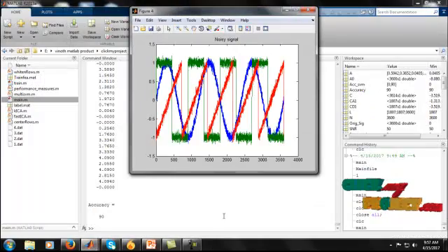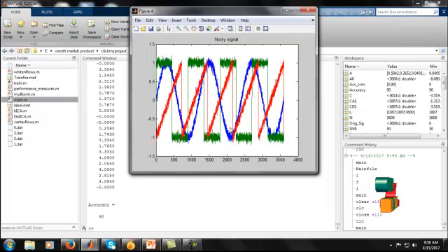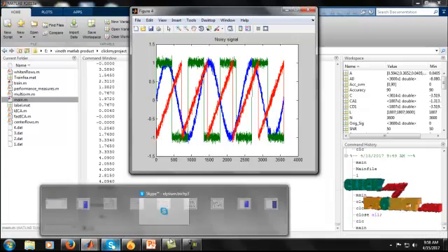Next we have to find the noisy signal from our wavelet transform. It is going to show our input signal as a blue color line and the external noise as a red and green color line. It is like a square wave or sawtooth wave that mingles with our input signal. So we have to extract the noise of our signal. So we are going to apply the ICA transform, ICA meaning independent component analysis.